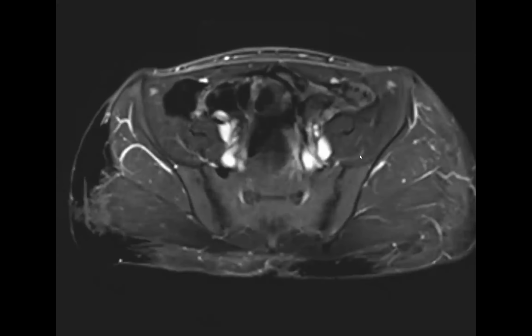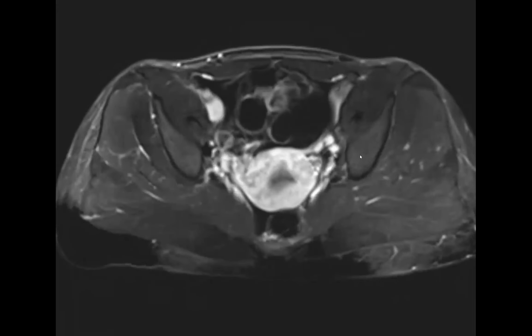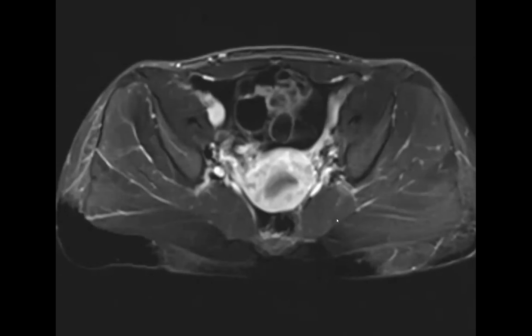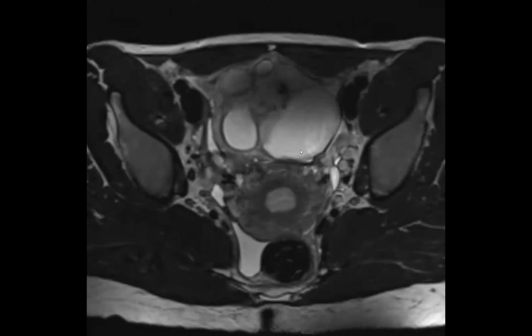So it's going to be a surgical lesion. It didn't have any fat in it in and out of phase. It didn't have any bulk fat. Anyway, there's no way we could have told what this was prospectively, but the final path, I'll show you the high res too. Here it is.